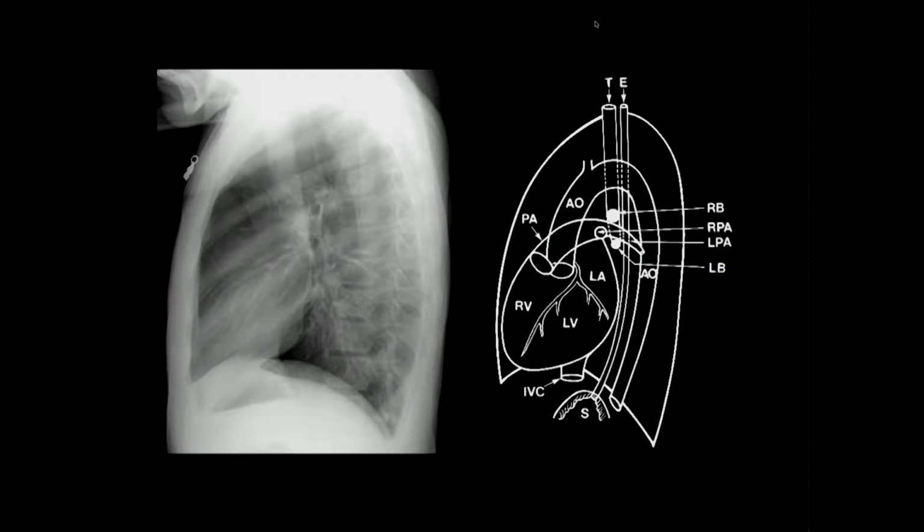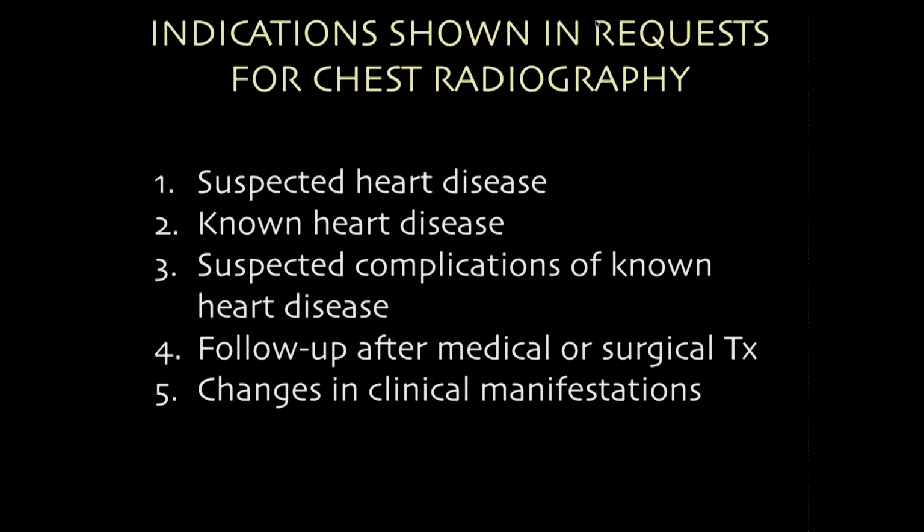The problem we have in infants is that this space is usually occupied by the normal thymus, and then you don't have the radiographic findings shown here. Anyway, that gives the overview of what you have known for a long time.